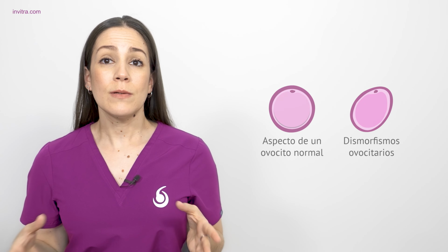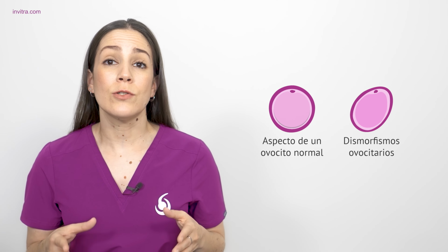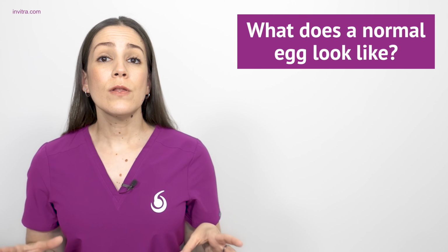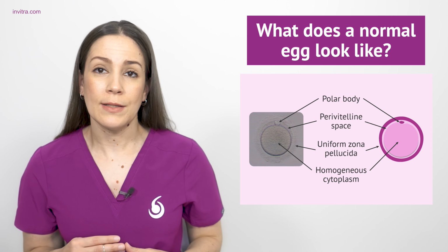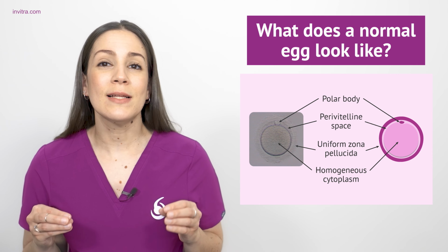In any case, let's take a closer look at what the appearance of a normal oocyte would be like and what types of oocyte dysmorphisms might possibly be found during its evaluation. A normal oocyte must properly exhibit a rounded shape and, in addition, have all of its structures clearly defined. A homogeneous cytoplasm without any foreign bodies that attract attention inside it.